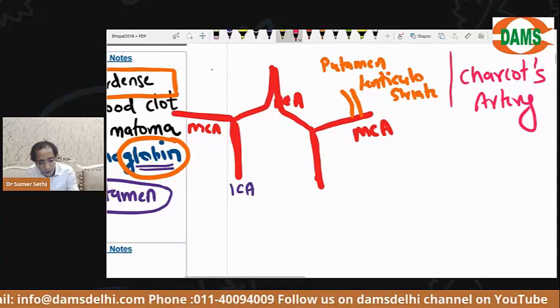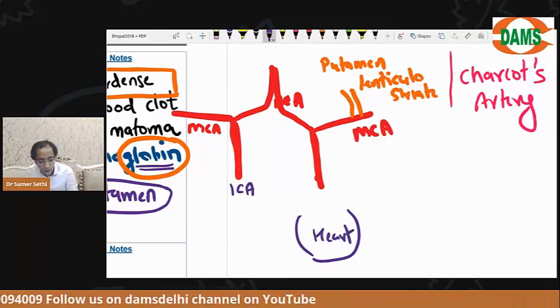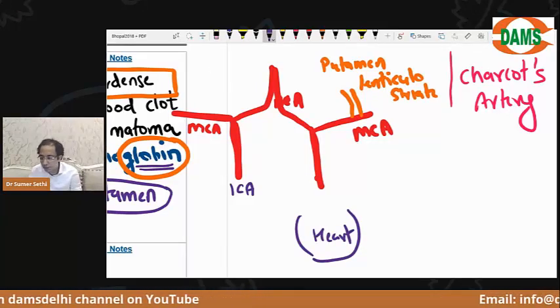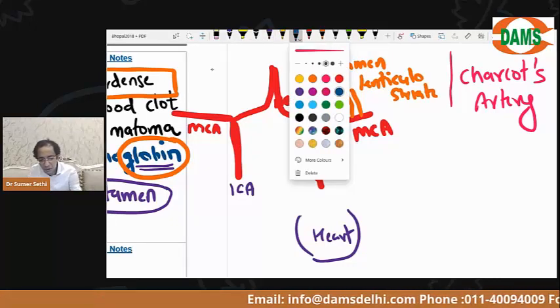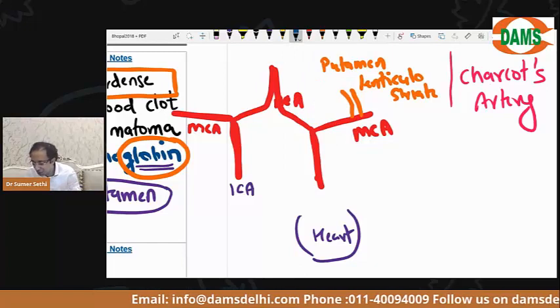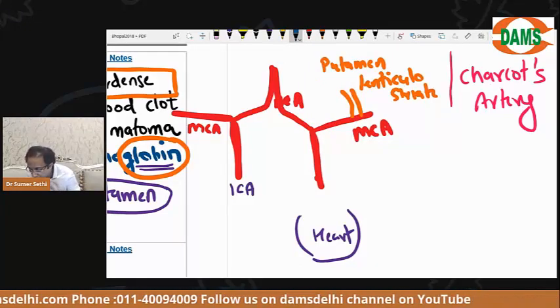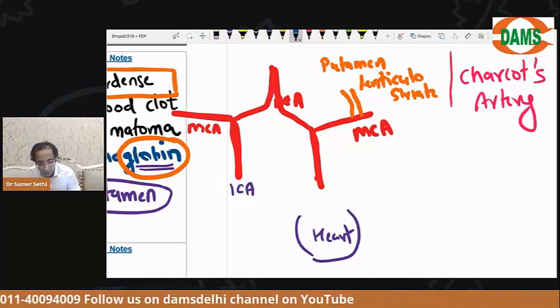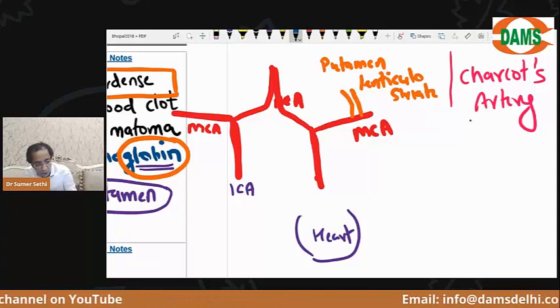Okay. Now this is where my heart is. I want everybody to see with me. बेटा सभी बच्चे देखेंगे. बेटा ट्यूमर करेंगे ना, अभी ट्यूमर में क्यों जा रहा है, अभी तो सिर्फ एनाटॉमी का लोकलाइजेशन दिखा रहा हूं. It is not due to calcification. Why putamen? Okay, listen to me. Why putamen specifically? Please see, this is the area which is supplied by the Charcot's artery.